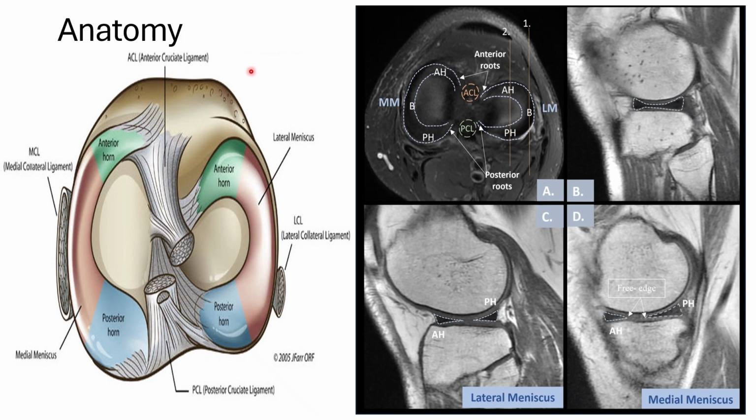Now the lateral meniscus. It is nearly circular. We can see here it is nearly circular. So this is the circular or O-shaped, covering almost 80% of the lateral tibial plateau. It has a smaller diameter and it is more mobile than the medial meniscus. So it less frequently undergoes tear or injury.